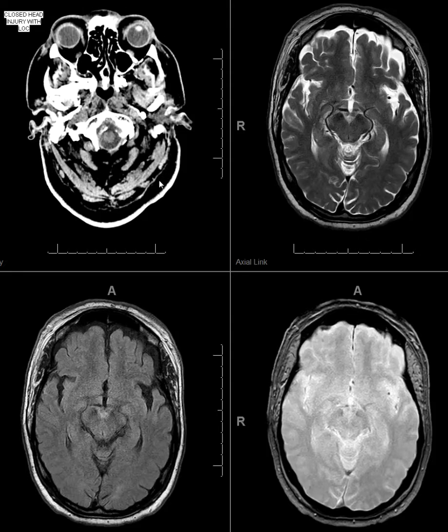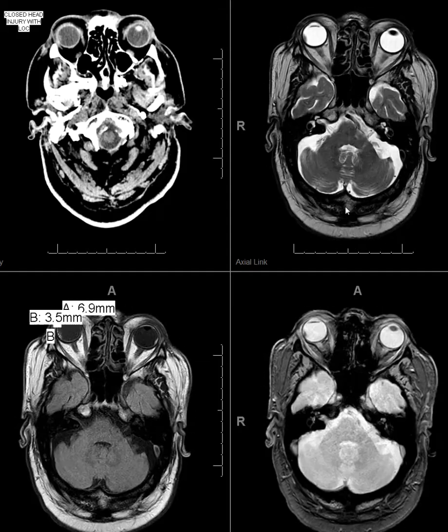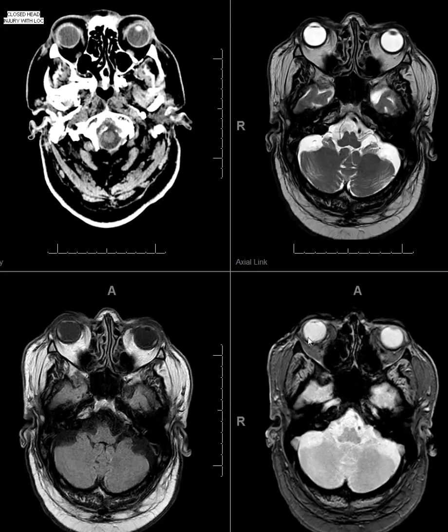But there's also a finding that was not called in this picture. On the CT, in this area, there's a small amount of subarachnoid hemorrhage. I'm sorry, a small amount of retinal hemorrhage, not subarachnoid hemorrhage, retinal hemorrhage. So I measured here, and then there's a small amount of blood here.